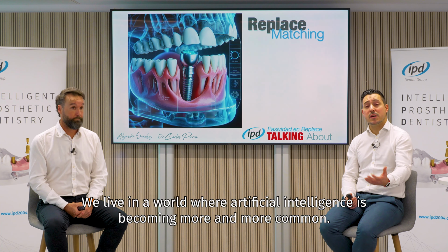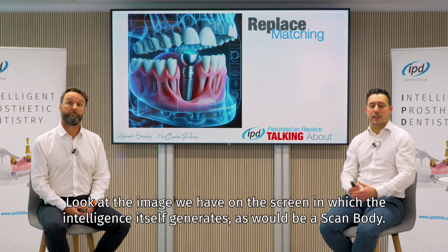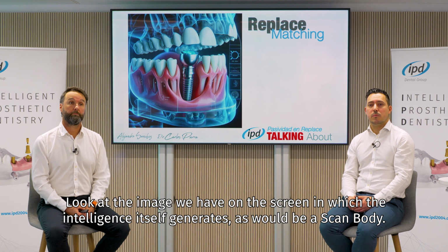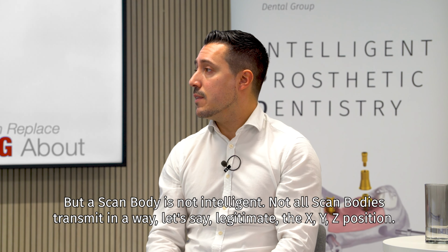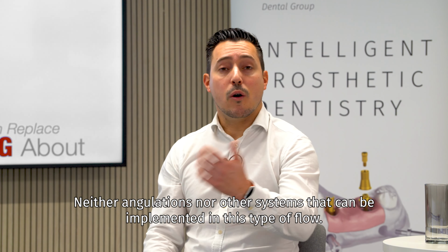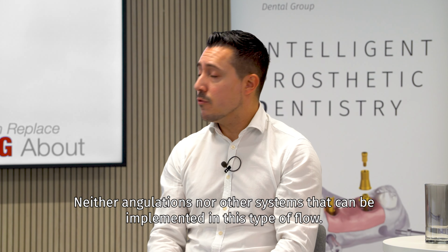We live in a world where artificial intelligence is becoming more and more common. Look at the image we have on the screen in which the intelligence itself generates, as would be a scan body. But a scan body is not intelligent. Not all scan bodies transmit in a way, let's say, legitimate, the XYZ position. Neither angulations nor other systems that can be implemented in this type of flow.